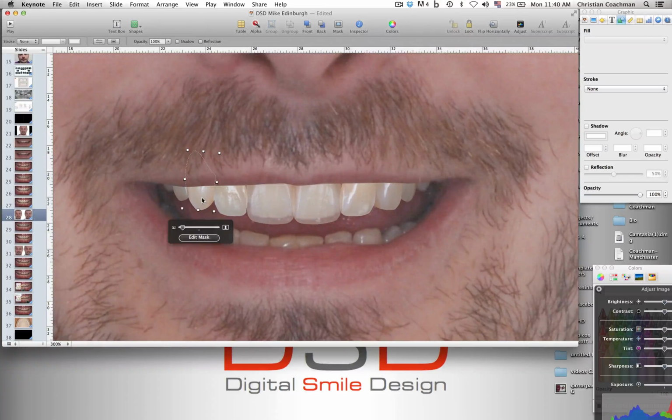For example, what's happening with the cuspids. How much? If you're doing soft tissue there as well, you could take away the lip. Yeah. So you can go back and forth on these pictures. Those measurements of where they are in relation to the pre-op teeth gives me where my wax.